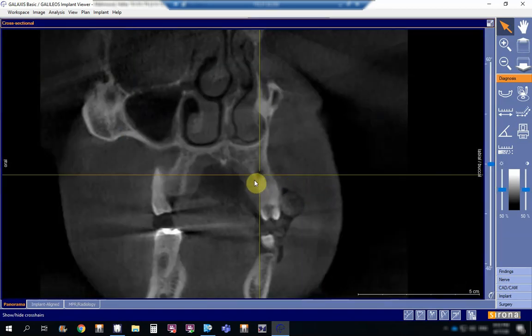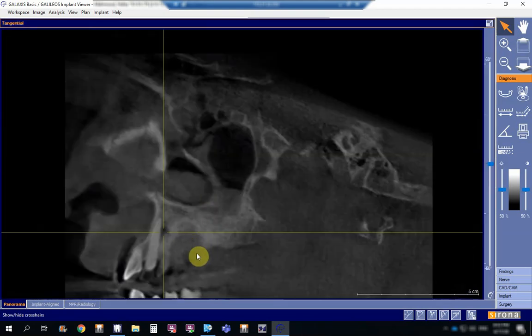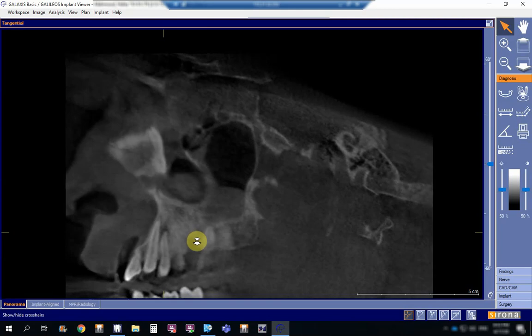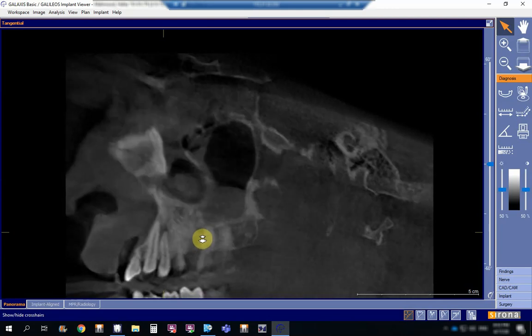How would we look at it from a frontal view or a coronal view? And this is how we are going to have a look from the sagittal view. In the sagittal view, we are closer to the nasal cavity, and this is the inferior concha, so we are more on the palatal canal. Now we've crossed the palatal canal, now we're in the buccal canal. This is from a sagittal view.